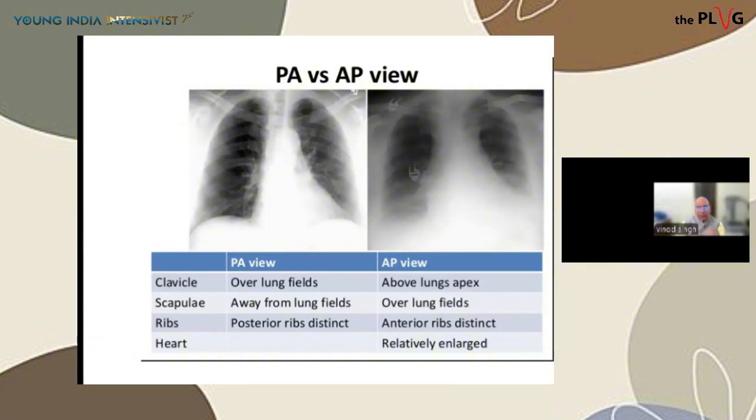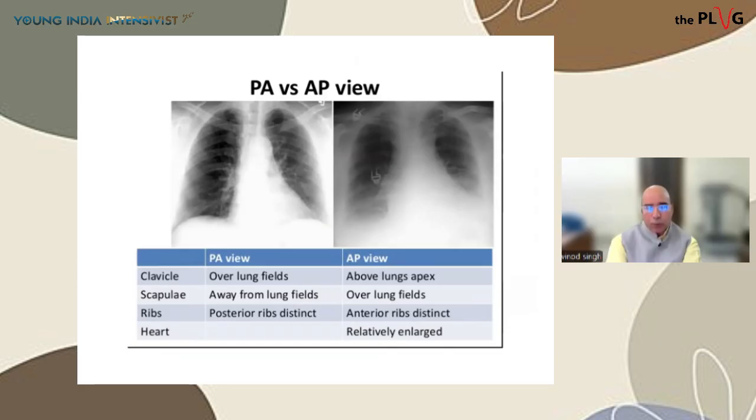Now, many times the examiner, or we ourselves, are confused whether it is a PA or whether it is an AP.